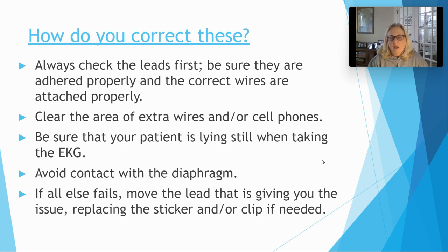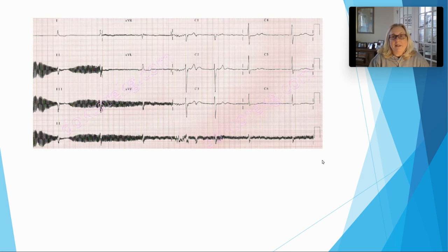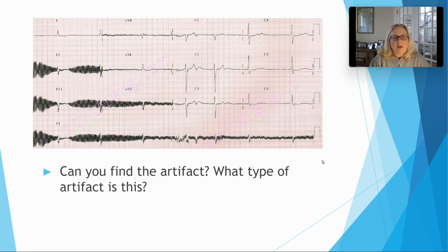Okay. All right, so let's practice. Let's see. Can you find the artifact for here? I'll give you like 10 seconds. I bet you can.